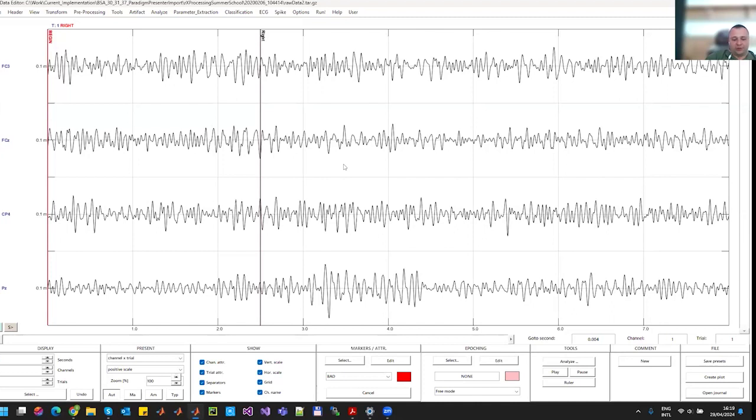There are publications stating that when using the CSP method, you only need 4 spatial filters: the first 2 and the last 2, which are the most significant filters. From this step on, we will have to compute the variance.